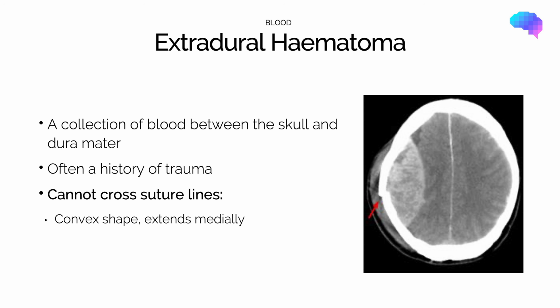So if the blood can't go laterally, it will build up pressure and cause the dura to be pushed in medially, creating this convex edge that we can see on the bleed here as the pressure builds up. You can think of this sort of like a hammock where you have 2 areas of insertion and a bowed convex edge where the pressure is building up.